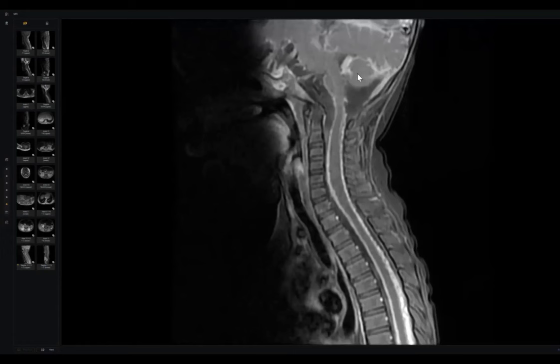Yeah, this is the brain. If you look here, you will not get the whole idea. But here, the brain. Then you must ask, and this is Dr. Omega, forget, you must ask in any leptomeningeal drop metastasis for the whole spine. Here, this is cervical and dorsal. So I helped here. Look here, this is extensive drop metastasis. You should see only CSF below the conus. All of these are soft tissue. Very important.